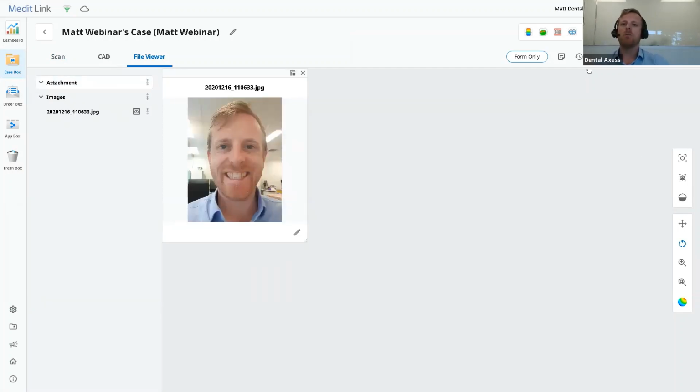So now let's go up the top again and click on the Smile Design app. We're going to open this up and we're going to get me some nice pearly whites. So we'll just wait a moment for this app to open. Let's just have a quick think about what my teeth are going to look like. I'm just going to bring this across from my other screen. Just loading this now. Just bear with me a moment. Just preparing the image.